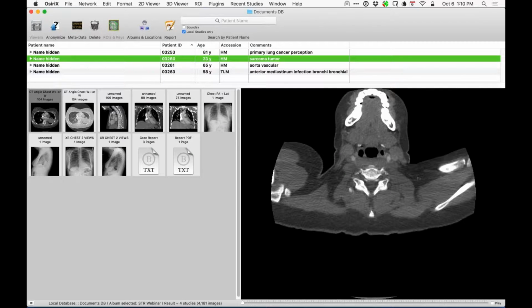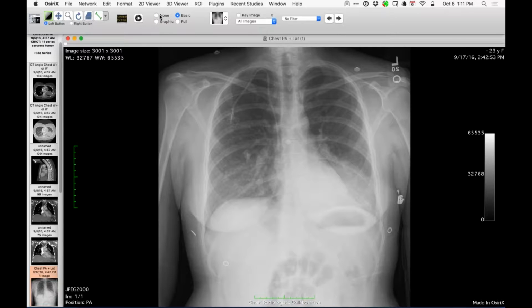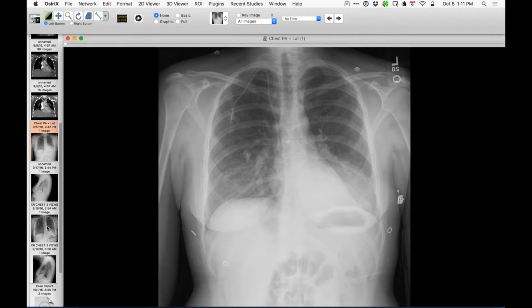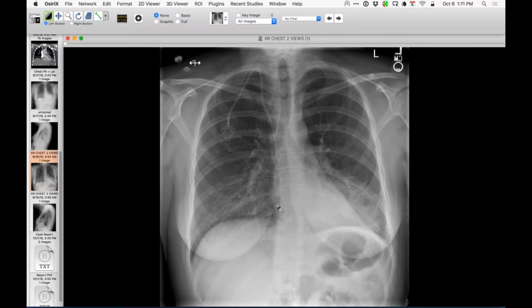So this is an unusual tumor in a young person, a 23-year-old. At this time, the patient, of course, has a catheter in already, and we see the abnormal opacity in the left lower chest. And I will show you in a moment a CT that we had from the outside done a little before. But it may be an example of an opacity that doesn't go away.